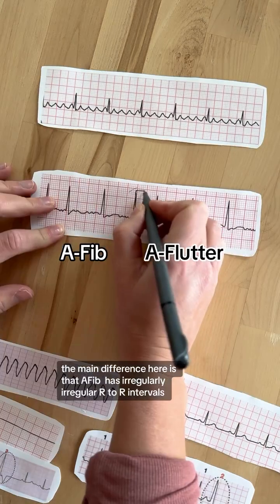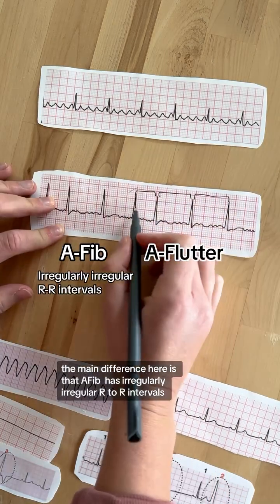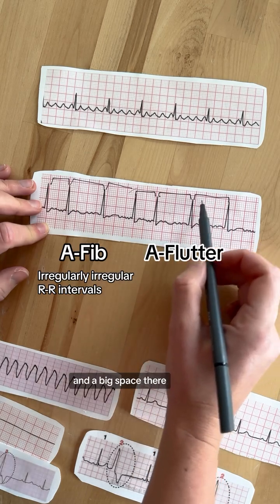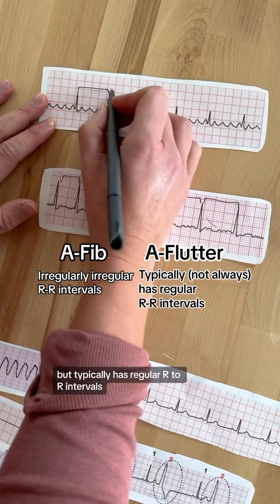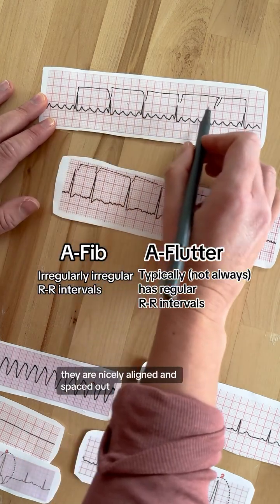The main difference here is that AFib has irregularly irregular R to R intervals. You can see how there's a big space here, a small space here, a small space here, and a big space. They're irregularly irregular. Where atrial flutter typically, not always, but typically has regular R to R intervals. They are nicely aligned and spaced out.